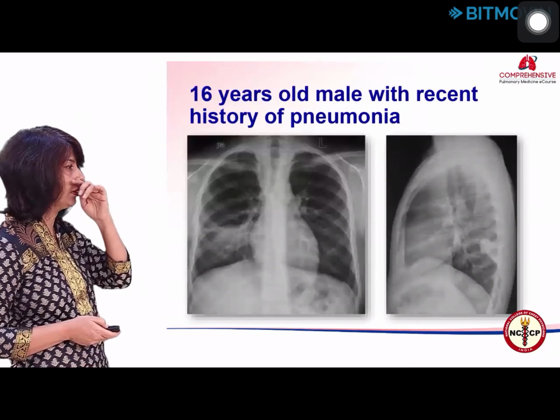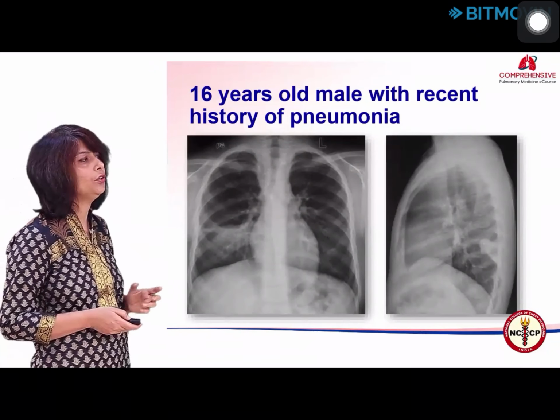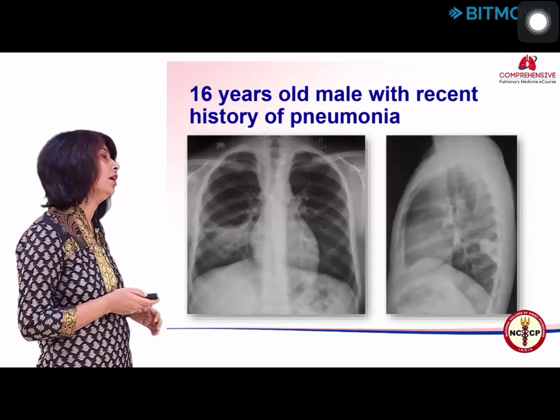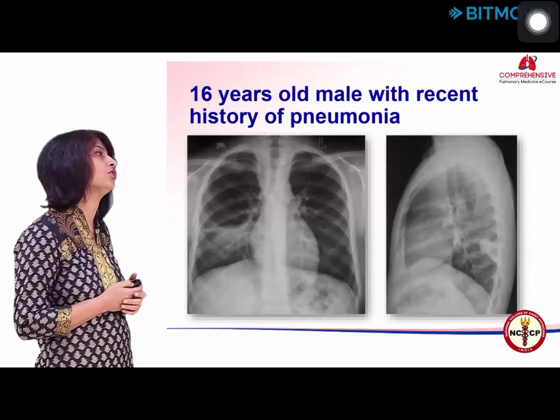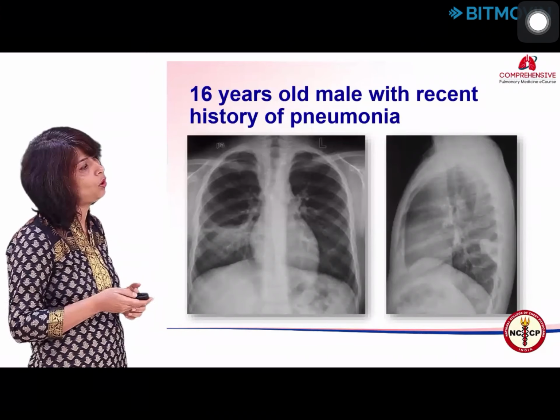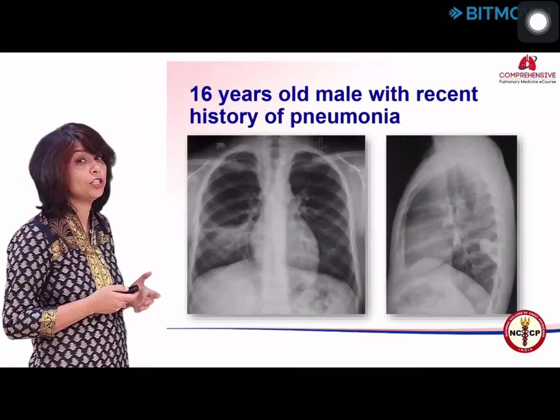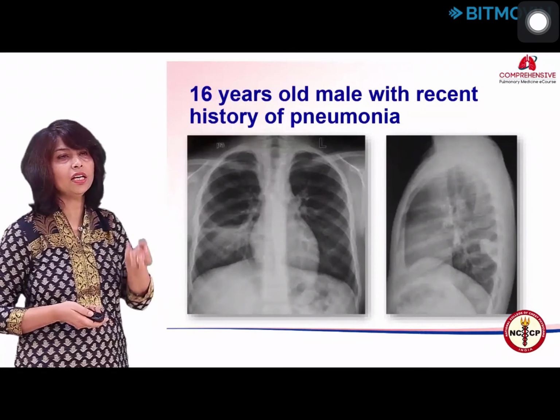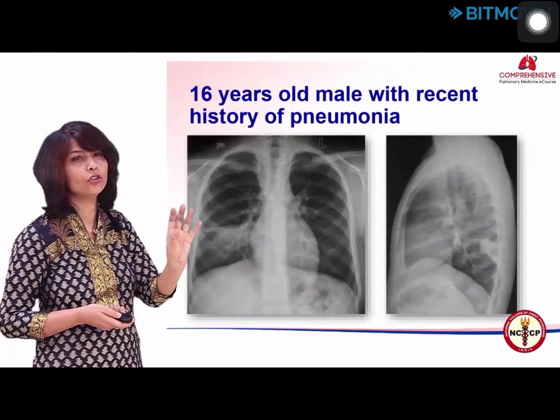As I said, consolidation heals and then you are left with lesions. Right middle lobe consolidation was given ATT or keeps on getting it because it's a non-resolving area. And then you do the lateral and it shows you this blobby thing along the posterior chest wall, which is not a parenchymal lesion at all. Why? Because it is simply a small pocket of loculated effusion.